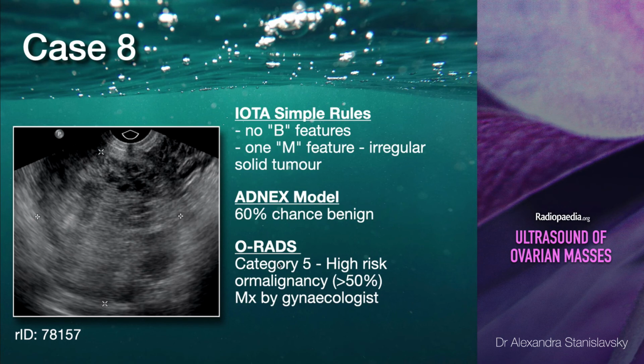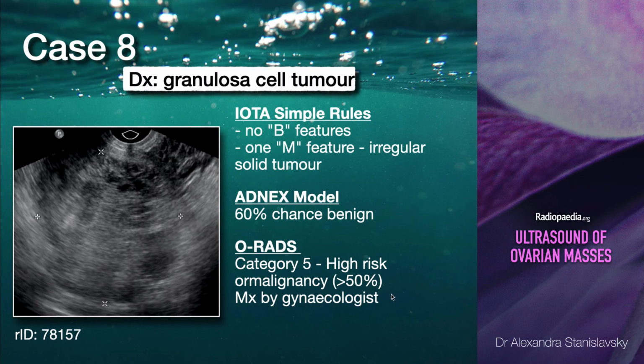And O-RADS, category 5, high risk of malignancy, management by a gynae oncologist. So that's a typo, and there's 2 typos there. That should both have been changed. So management by gynae oncologist, category 5 lesion. And this was a granulosa cell tumour, right? So we're within that sex cord stromal area.